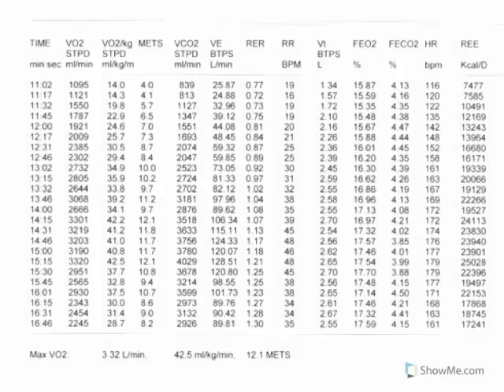Curtis got done performing his max test, and this is his data. Depending on the machine that you use to collect the data from your client, it'll be a little bit different, but there will be certain things that the machine will give you in a readout. So this is what we're going to look at.